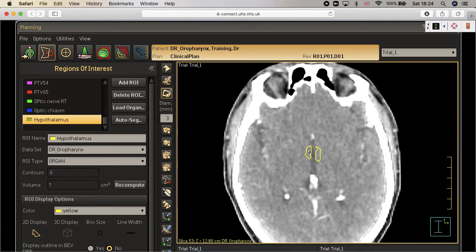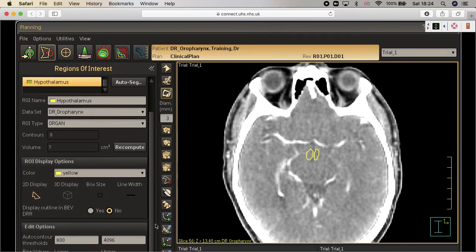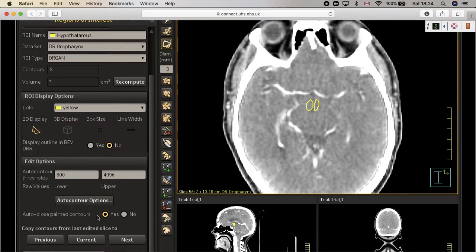Thickness is 3 millimeter. You can say, but how long posteriorly? I would say it's very arbitrary, because I cannot see the gray matter there. And because we did the mammillary body and we did the structure in between the tract, all I have to do now is to interpolate between both and show how it will look. Yeah, a bit tricky, but believe me, it's not bad.